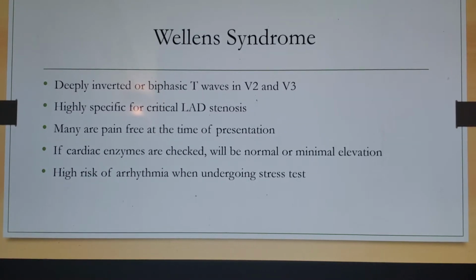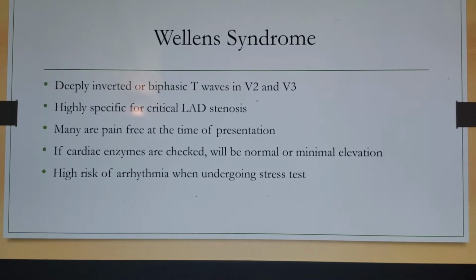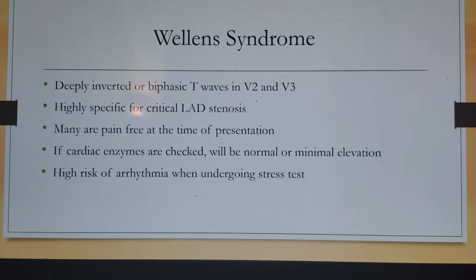Many people that have this Wellens syndrome are completely pain-free at the time of presentation. So you may be getting an EKG for a totally different reason, or they may not be having any chest pain at all, and then you may see this. And if you catch it, you can actually refer them to a cardiologist and save their life down the road. If cardiac enzymes are checked when this is in place, they're usually normal, or if anything, just very minimal elevation.